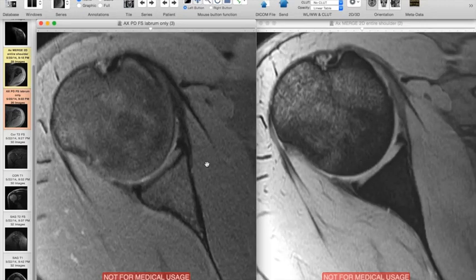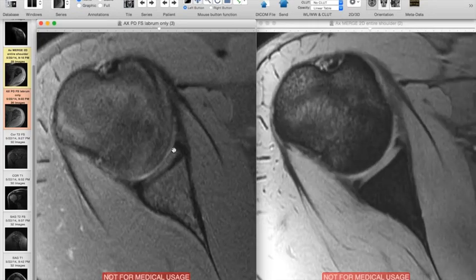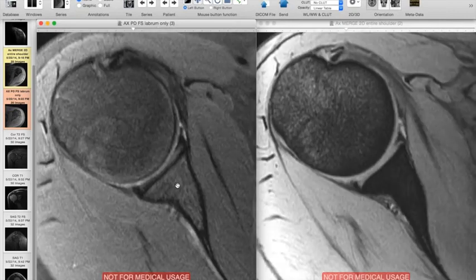And as you go inferiorly, that's where I always say that's sort of where the money is, because most shoulder dislocations are antero-inferior, and as you're inferior, it's going to be that anterior-inferior labrum that gets torn or detached. So right in here, this is the inferior labrum. We're starting to get into the inferior capsule. We'll look at that a little bit more in just a moment.